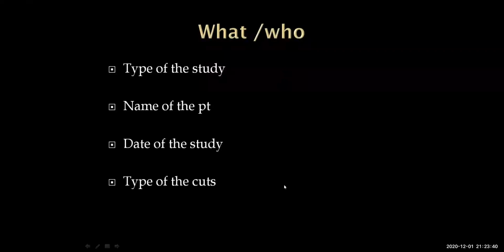Okay? So when you have the MRI back at your clinic and you put it at the viewing box, from the start you need to declare whether it is plain or uses dye. Sometimes outside they're using a dye, but here in Sudan we are not using an MR contrast. So most of the pictures here are plain, but you should be systematic. You should put it at the back of your mind. First of all, you have to define whether it is plain or a contrast MRI approach.